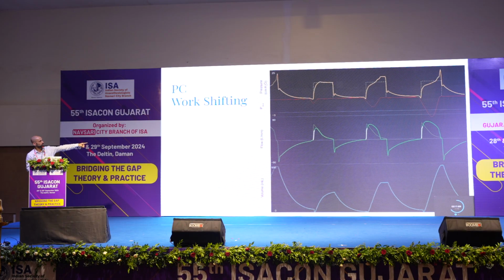So in pressure control, look at the pattern in the middle part, flow time scalar. A passive patient will show an exponential decay. A little bit of effort will be convexity and a lot of shifting will show much more pronounced convexity. That convexity will have more than 50% of the area under the curve occupied by the patient's effort. Again, something to keep in mind.